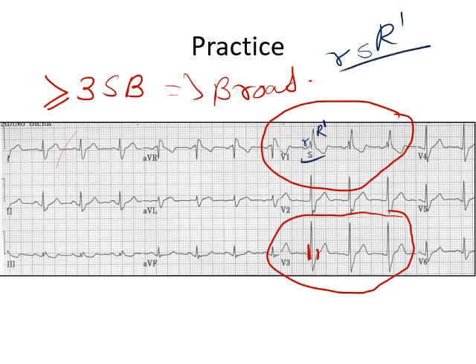So it will come again in future in the videos of bundle branch blocks, but if you see a RSR dash pattern in V1, it is indicative of right bundle branch block. Again, I am going to talk about it in detail. At this place, the purpose of this ECG is only to show you guys a broad QRS complex.